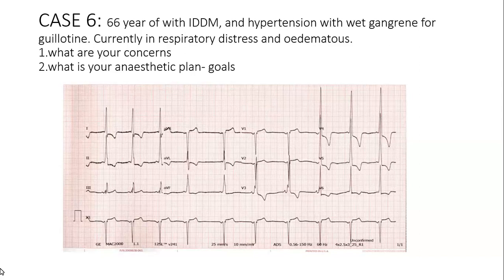Okay, what's your spot-on diagnosis? There's lots going on with this slide, but what's your spot-on diagnosis?